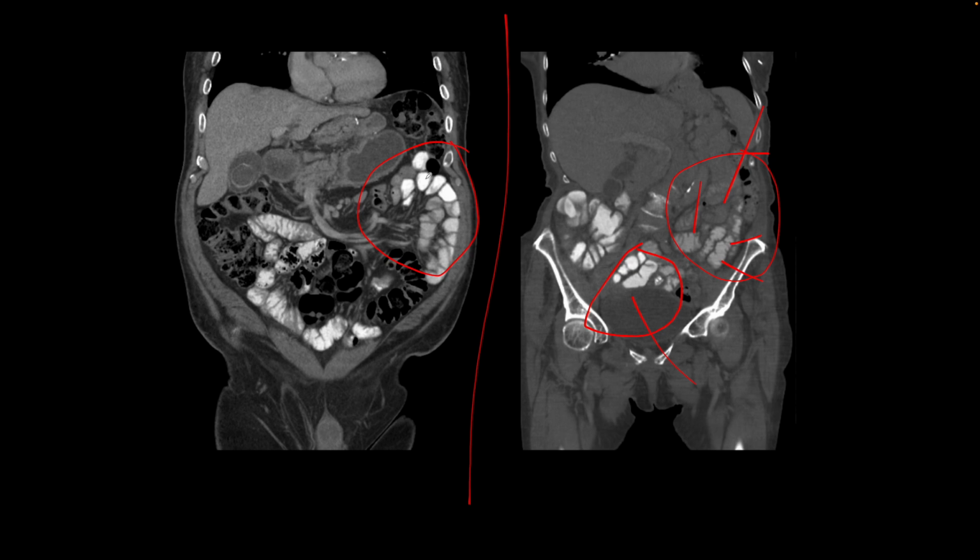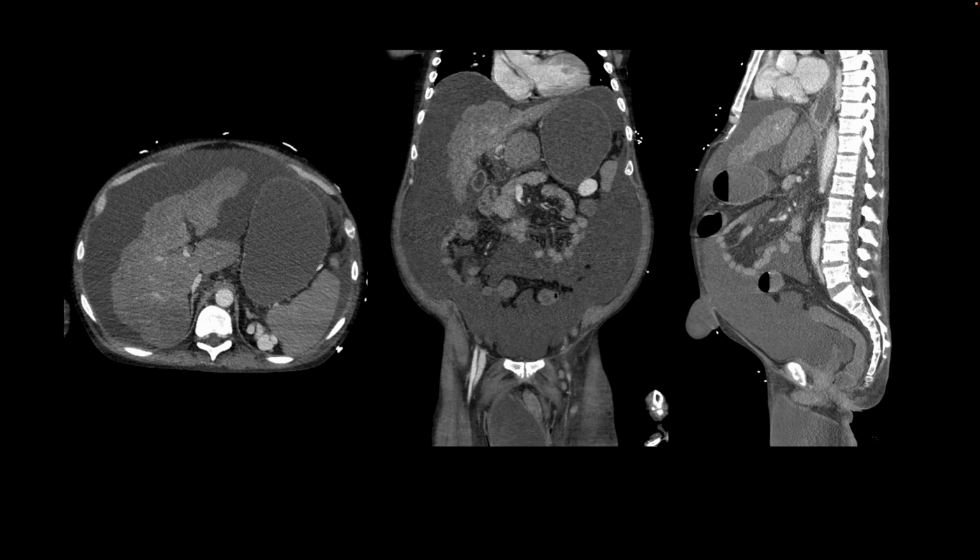And now look what happened here in the proximal small bowel compared to the distal small bowel. There is a reversal of mucosal pattern between the proximal small bowel and the distal small bowel, and that suggests a diagnosis of celiac disease. So look for it, and when you find it, it would be helpful in patient management.